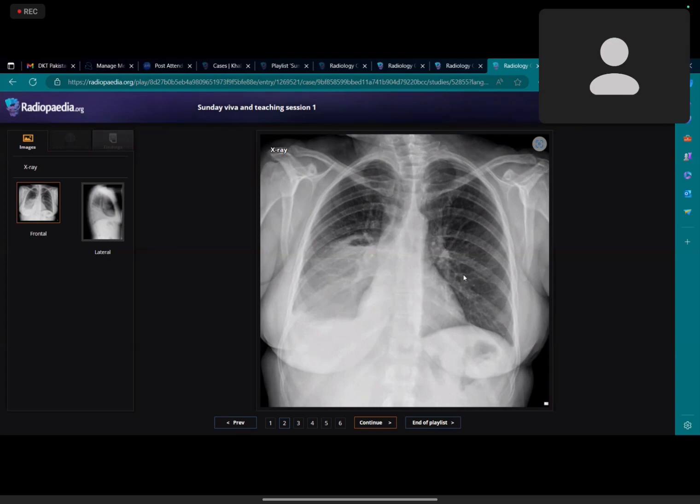That shows this is a middle mediastinal lesion with obliteration of the right CP angle, consistent with associated minimal pleural effusion. Underlying fibrosis must be there, which is leading to the shifting of the trachea towards the ipsilateral side. I cannot see any associated nodules in the rest of the lung parenchyma. As the patient is a smoker, I will be concerned about any primary lung lesion and would investigate this patient further with contrast-enhanced CT chest to look for underlying pathology.